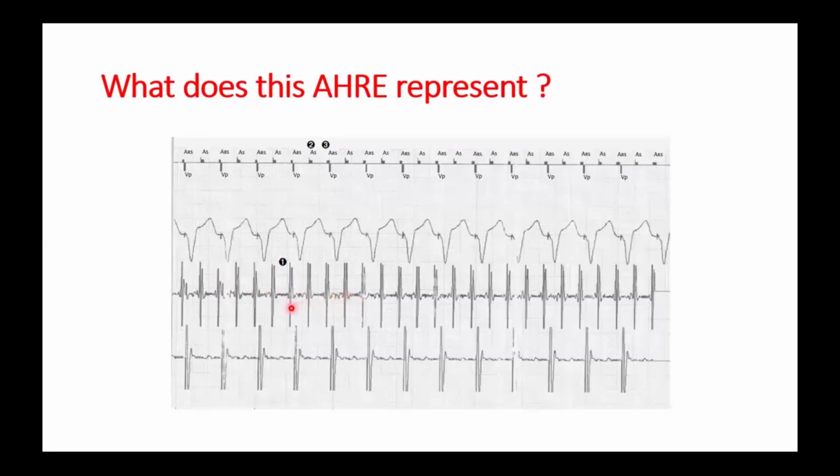Okay, this is actually an atrial flutter from the atrial channel, and here the atrial flutter is being tracked. One beat is atrial sensing followed by a ventricular beat, and the other is falling in the post-ventricular atrial refractory period. So this is a flutter which is being tracked.